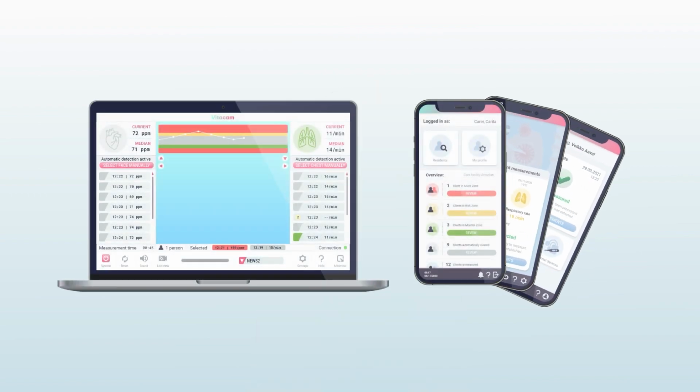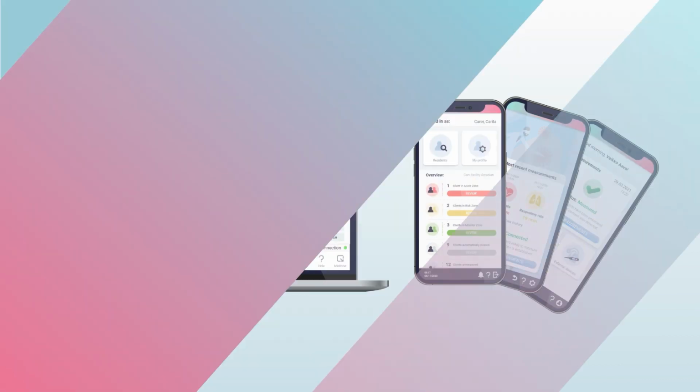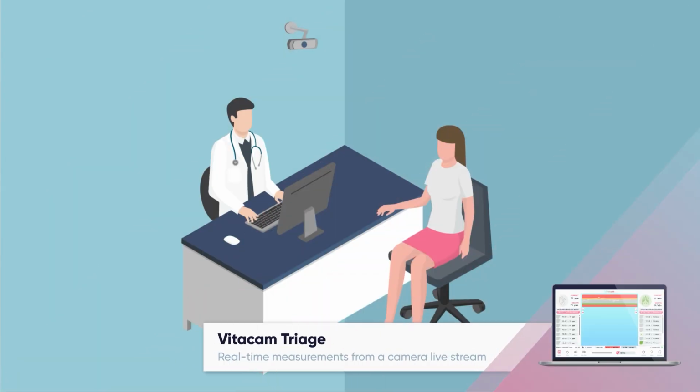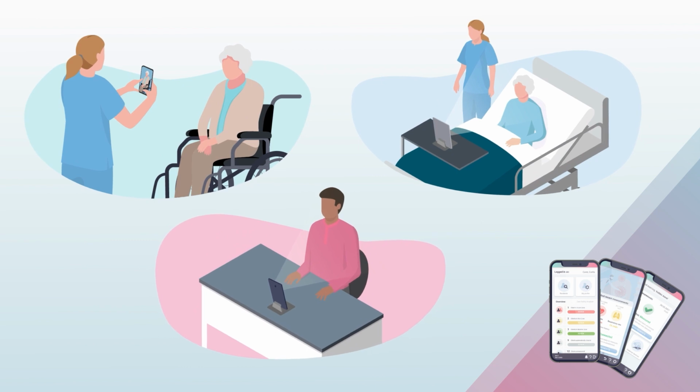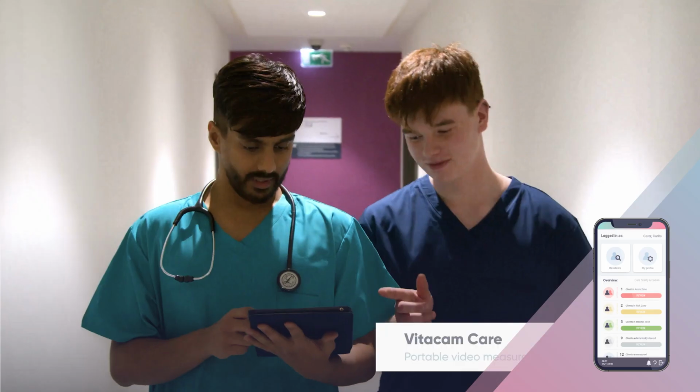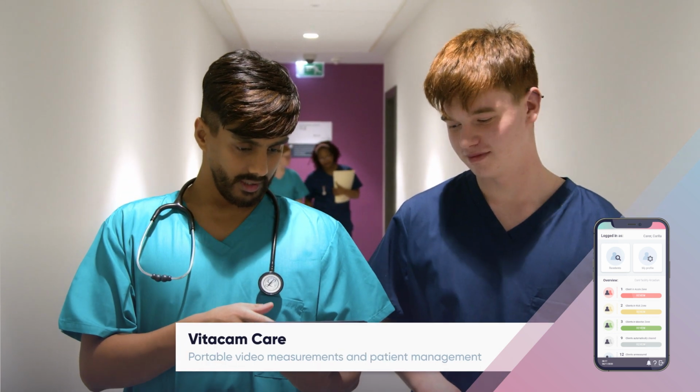Vitacam is available both for mobile devices and the PC. On a PC, Vitacam Triage is intended for real-time monitoring of a patient through live stream video, while the suite of Vitacam mobile apps produce measurements from a short video clip recorded using a mobile device's inbuilt camera and sent to the cloud for processing. In this video, we will be covering the Vitacam Care application.